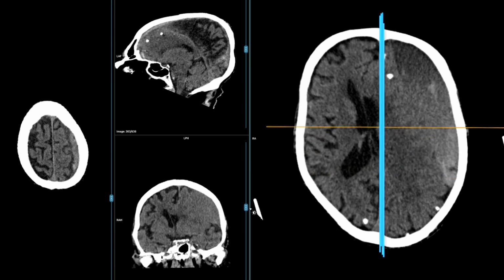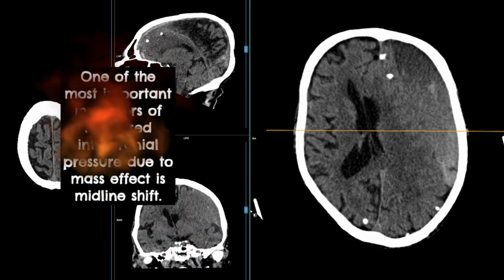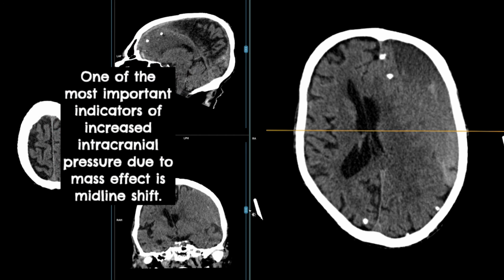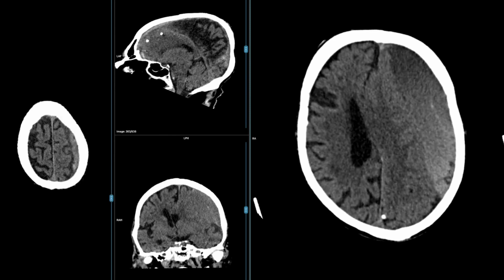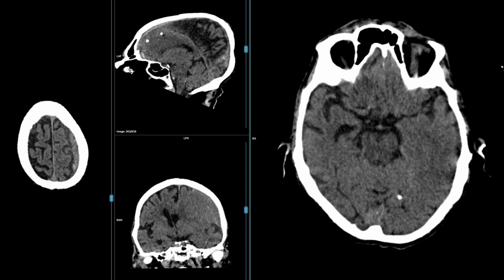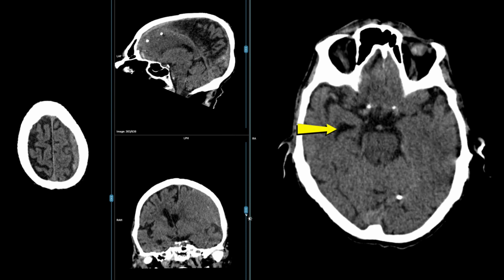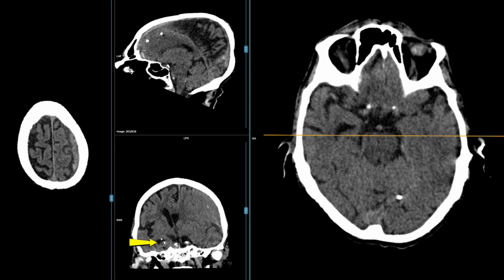When we get this much of midline shift, we should also be thinking about hydrocephalus, or increased pressure within the ventricular system. We look at that by looking at the temporal horns of the opposite lateral ventricle, depicted here, also seen nicely on the coronal images. This increases in size when there is hydrocephalus, as is in this case.